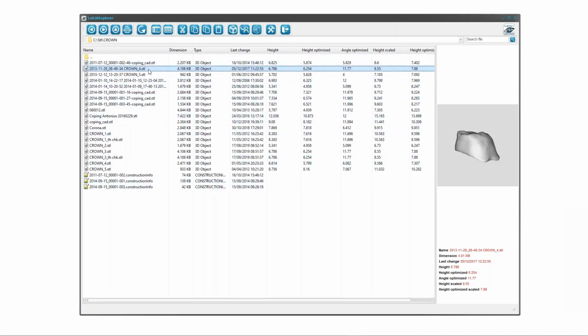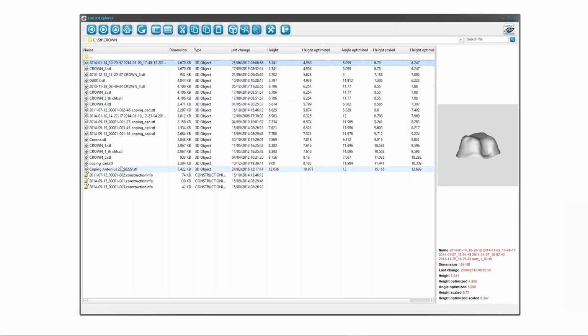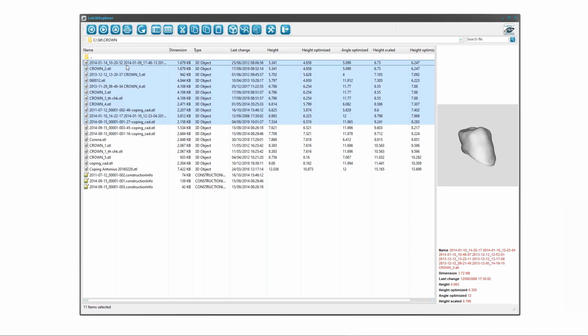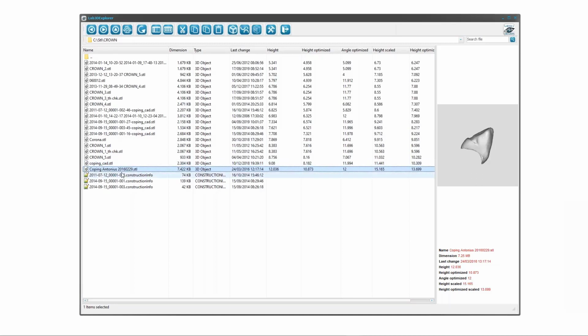What does it mean? For example, you can sort all the files from the smaller one, the thinner one, to the wider one. In this way you can say, okay, probably the first element can be executed in a particular disk, for example 10 from here. Then the last one, maybe another higher disk. This kind of analysis is pretty interesting before starting the job.